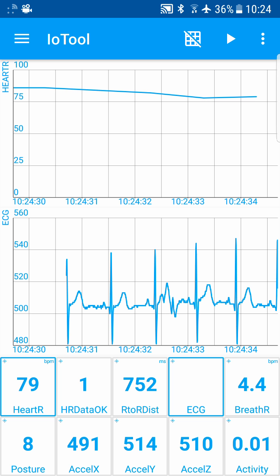Okay, let's try to add additional context to that sensor. Let's install a new extension which is called internal audio video, so we can add a real-time camera to that dashboard, so we can add additional, how to say, context to it.